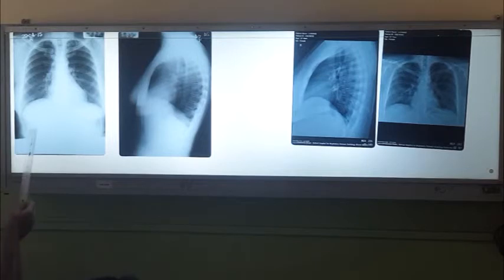And if you can't see the intervertebral disc through the cardiac shadow, everything will be whitish, and all these whitish areas may be due to soft tissue shadows there and may not be having any inflammatory shadows. Okay, so exposure is important. So look for everything before reading the X-ray, right? Then when you want to read the X-ray, you have to have some order.